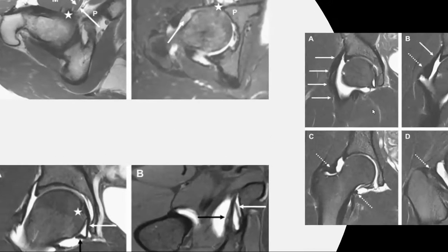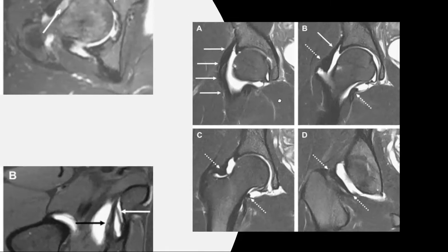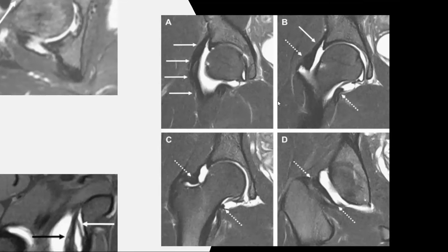These images demonstrate the hip ligaments. We have contrast in the hip joint, so this is going from front to back. We can see the femoral head, the head and neck, and then the posterior aspect of the hip joint. The bright contrast really dilutes and distends it to make these ligaments more conspicuous.